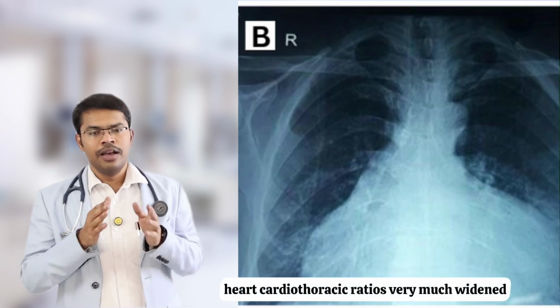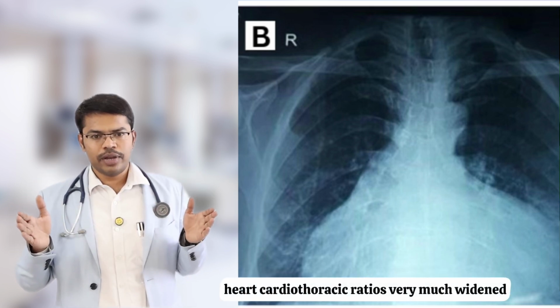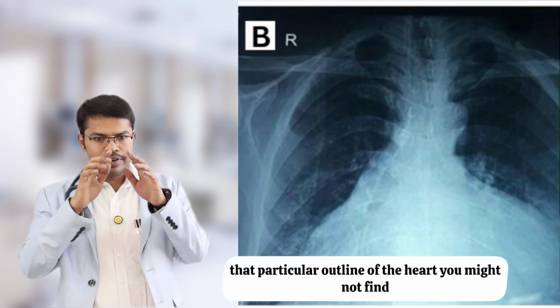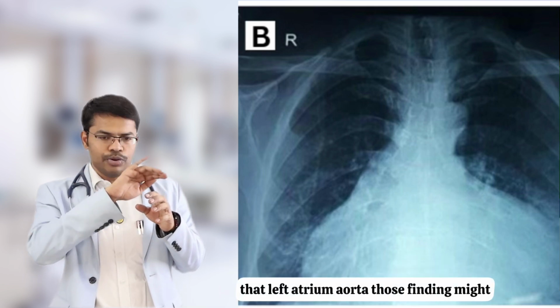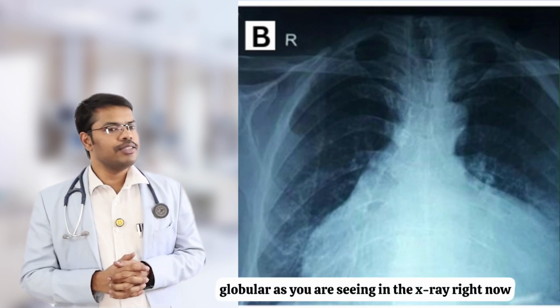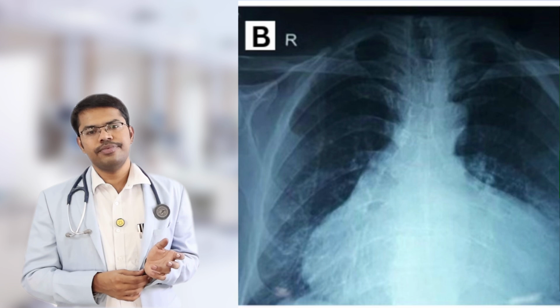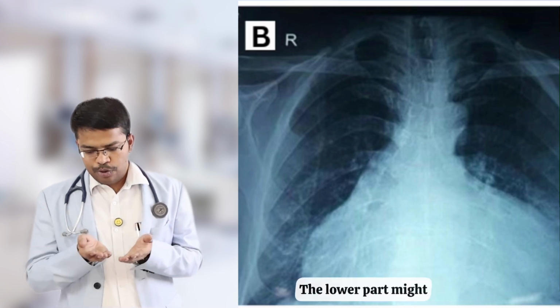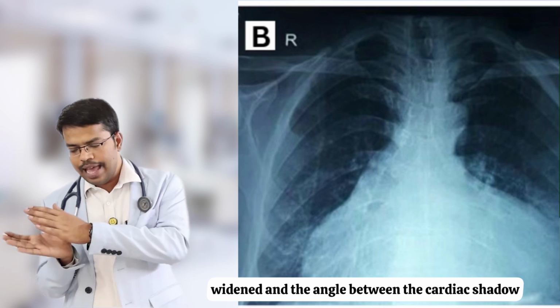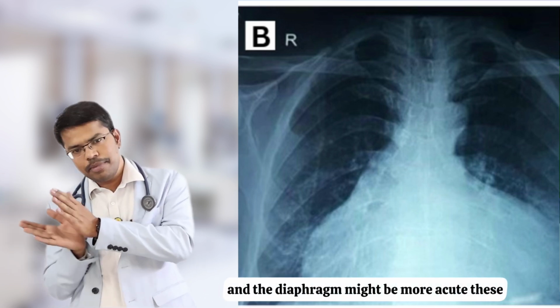Globular heart, cardiothoracic ratio is very much widened. That particular outline of the heart you might not find, that left atrium, aorta, those findings might not be there. The entire heart might be somewhat globular, as you are seeing in the X-ray right now. The lower part might be widened, and the angle between the cardiac shadow and the diaphragm might be more acute.